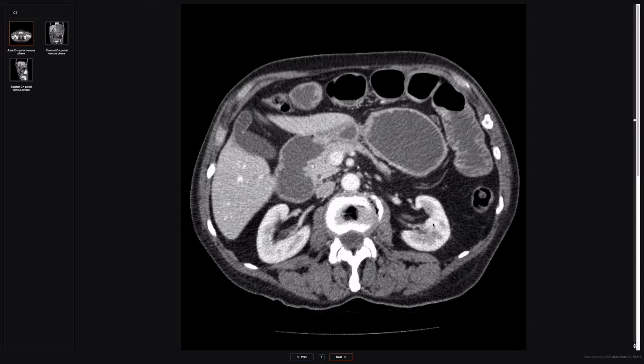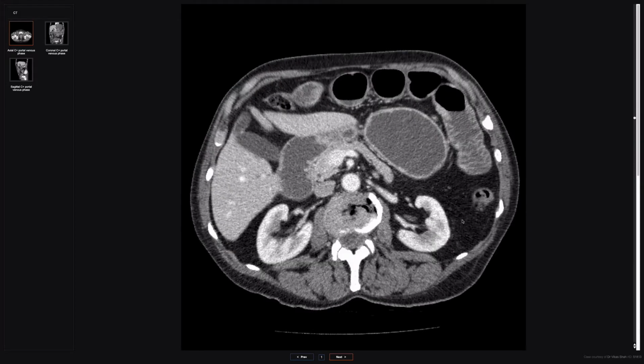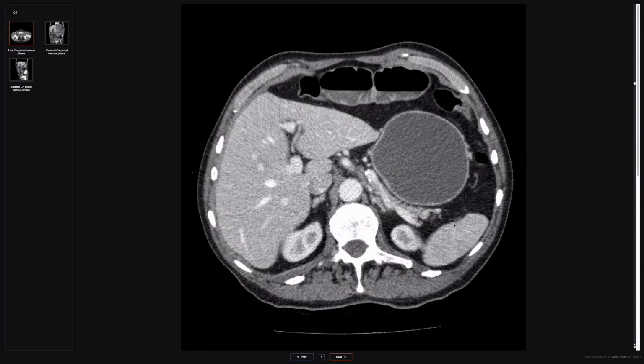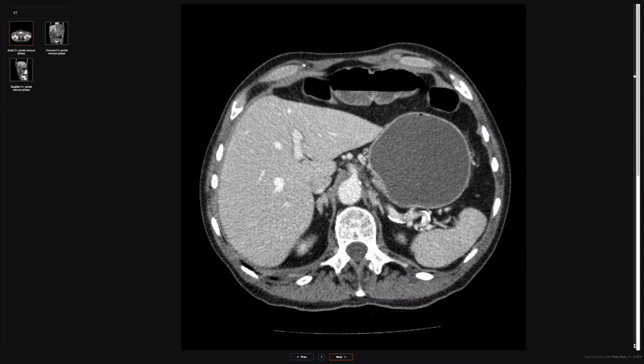That's because very slight changes in patients' cardiac function and cardiac output can influence what the organs look like, because everyone's physiology is slightly different. So there will be slight variation in the enhancement of the kidneys. Even when you have 5 CTs in a row which are labelled as portovenous, they won't all look the same.